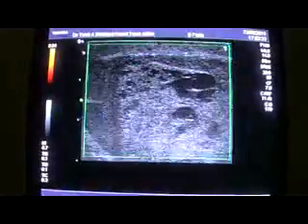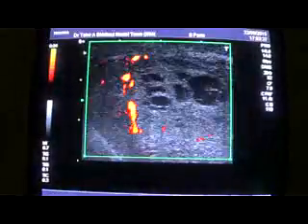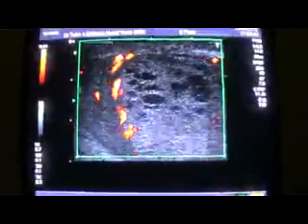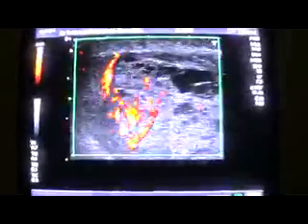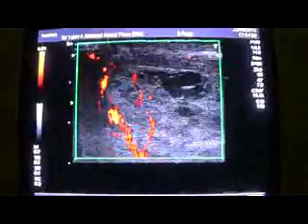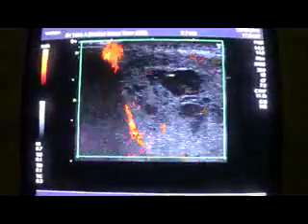Now this is our study of the day. Either abscesses or torsion. No, I will rule out torsion. This is some granulomatous disorder affecting the right testis, and these are suggestive of abscesses. The cystic areas are suggestive of abscesses in the right testis.